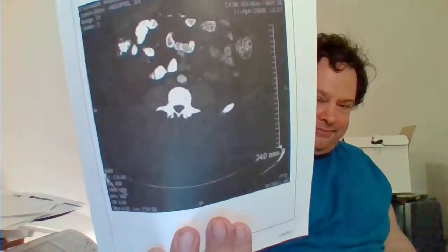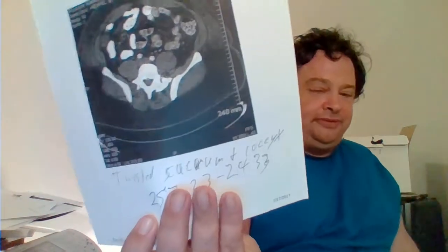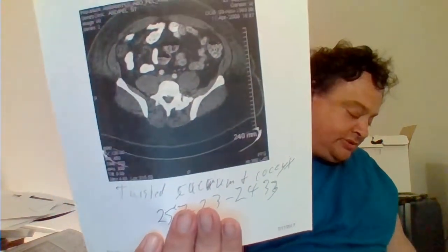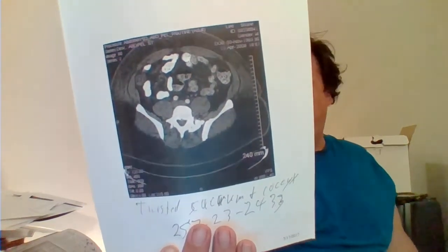Right. We're going back a little bit. Now, this is probably a few millimeters, I guess, right? But it's up too high. One side's up too high. Now, this is, of course, further down, right? But you see, again, the lack of uniformity?